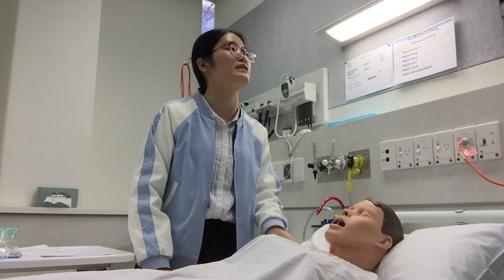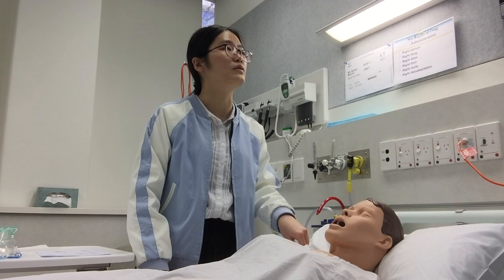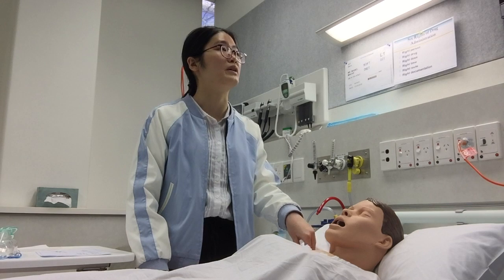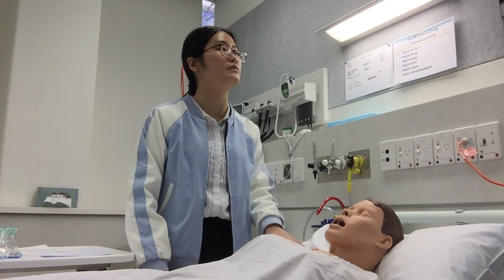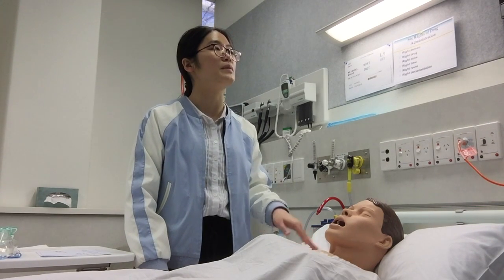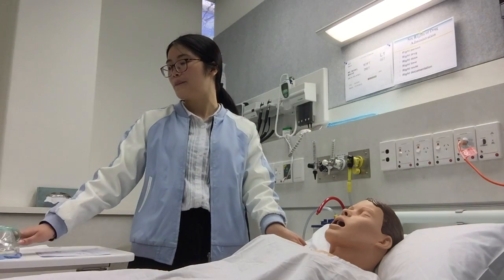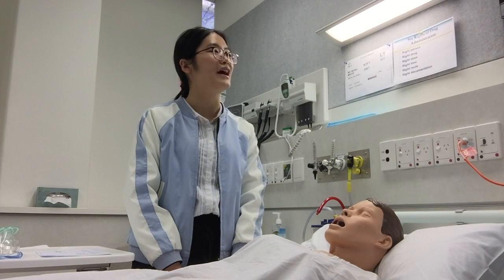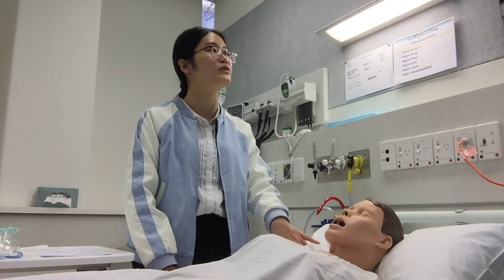The other experience is to always have a look at the patient's notes, where there will be prescriptions from doctors, because oxygen sometimes is a drug. The doctor will order the oxygen for the patient, and different patients will have different amounts ordered. So you need to make sure, and if you're not really sure, you need to double check with the doctors. Is that okay? Yep. Okay, that's all. I think you did very well, and you have a good understanding of the differences between the oxygen delivery devices.